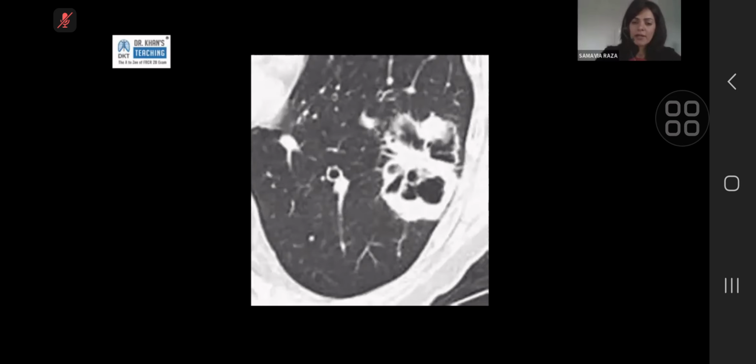In that case, what you look at is the soft tissue component, because a cystic lesion, you can't biopsy, you can't PET it to get confident results. You ideally should follow it up if you're worried about the soft tissue. If you are going to action it now, you want significant size in the soft tissue to be able to PET it to get a definitive answer.